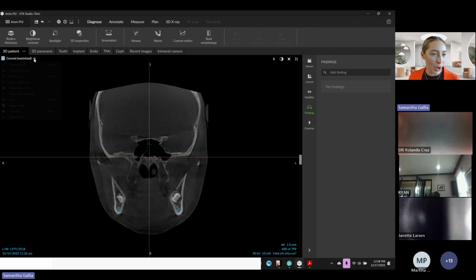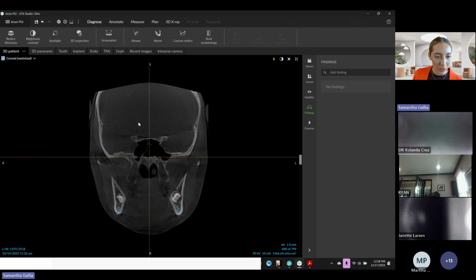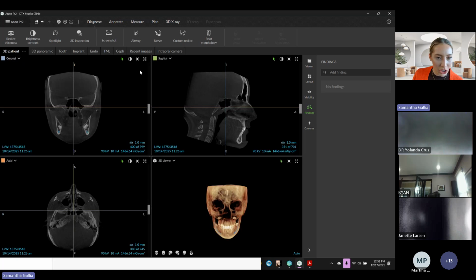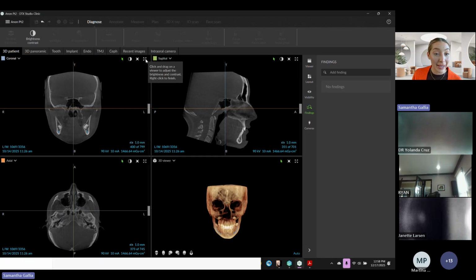Like I said last time, this isn't the software that I always use, so I'm a little clunky with it, so bear with me. So we talked about previously, the way that we can adjust our brightness and contrast is to go here, and then we can drag. So changing our brightness by going up and down, our contrast by going left to right. And I want to encourage everyone to let it be a little less contrasty than you would probably like to see.